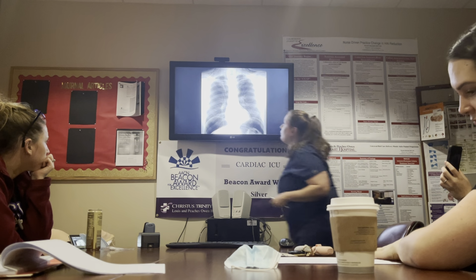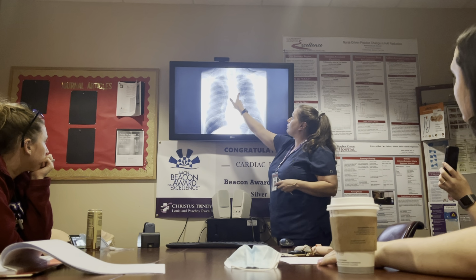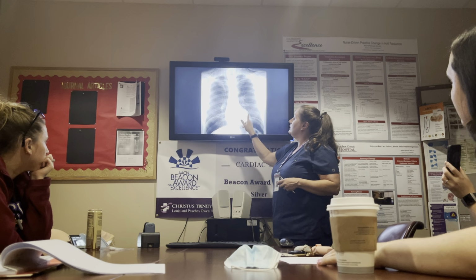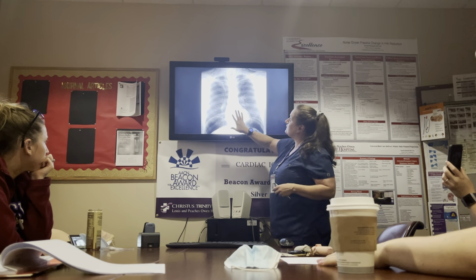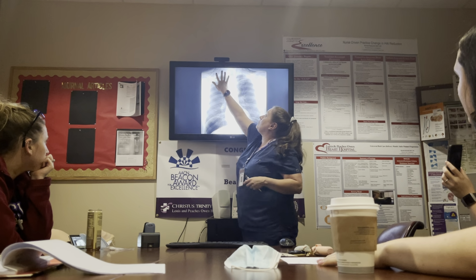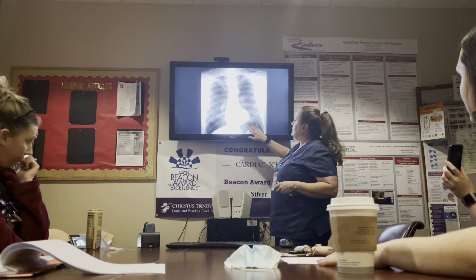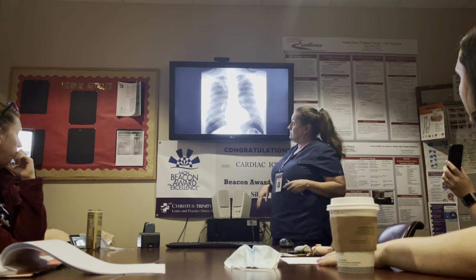And here's a little bit more pictured here, and you can kind of sort of see there's a stripe there of air going down. And again, this is not a great film. You see supraclavicular air up here, so you know that the air is going this direction, okay? But they've got air on the diaphragm as well.